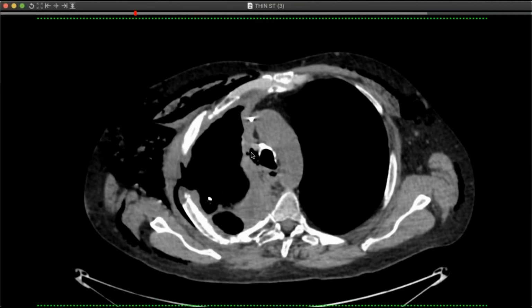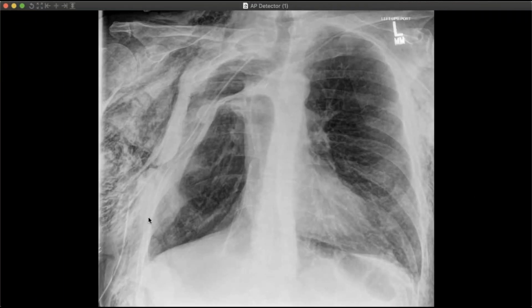So I don't know. Have you ever seen a muscle flap do that? And the subsequent radiograph actually shows that the soft tissue is gone. Nope, never seen that. Yeah, I had neither, nor anything quite like that. No. Yeah.